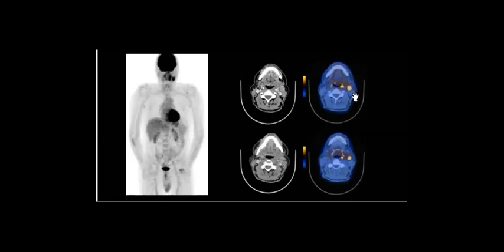But when he did the PET CT, we found this one, which is what we saw here in the CT. But there is something in the PET CT that is not present here. You cannot see it well, right? If you just look at the CT, maybe you cannot find it. Yes, Rabab, thank you. It's the left tonsil. So high uptake in the left tonsil.